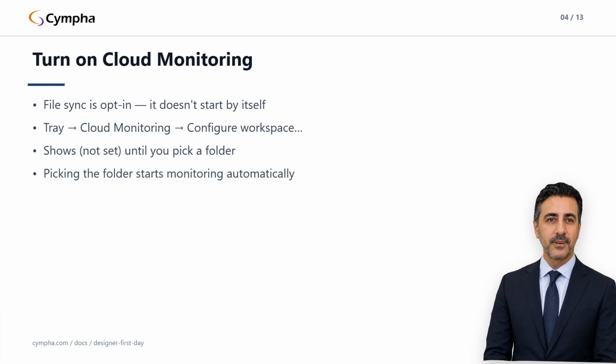Now you wait for the lab manager to assign you a case. And when they do, two things happen at once. The case appears on your My Assignments page.